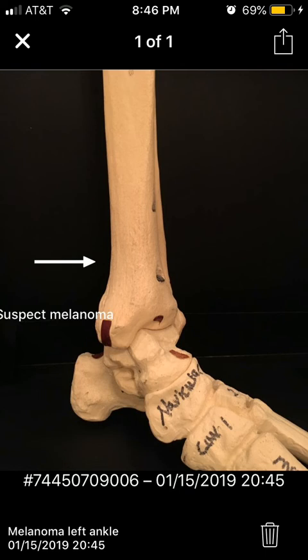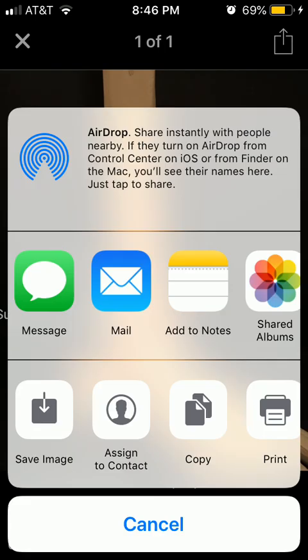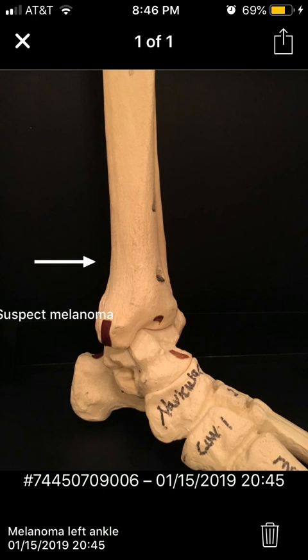Now you can adjust this image, and as you can see at the bottom, the demographics are in the image already, and the text that we added, suspect melanoma, were also included off to the side, as well as an arrow which could point directly to something or aspect of a lesion that you're looking at. Now this image is made medical legal by the fact that it has the demo of the patient at the bottom, also the time and date stamp, the title, etc., etc.